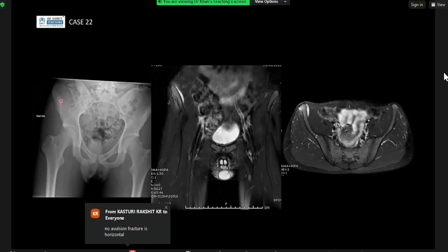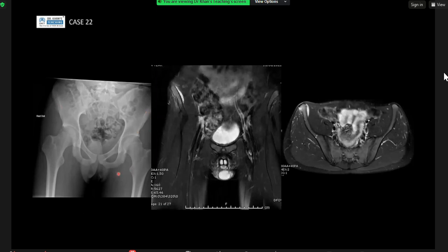The main thing to note is that in kids, you need to know all your sites of potential avulsion fracture. What you look for is the asymmetry between one side and the other, making sure it's a properly centered radiograph. And this one was, but I think the orthopedic surgeons just wanted further clarification, hence we got a nice image for teaching. On first impression, if you just saw this in isolation without the X-ray, you might think, is this something more worrying because of the marrow edema and the soft tissue swelling? Can it be something more sinister like sarcoma?